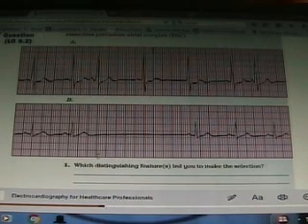A is what? Is your PAC. Premature atrial complex. Because it happened what? Prematurely. Happened too soon. So I could do that. Can I do that on an exam? Like show you the picture and kindly say, identify. Is this tachycardia? Is this bradycardia? Is this PAC? Or is this a sinus pause for the one on the top? How about the one on the bottom? Could I do the same exact thing?